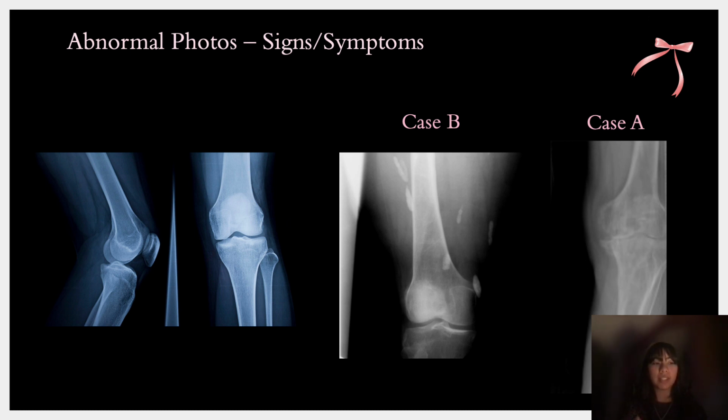And what happens is they basically shoot out in ulcers and blisters. They come out of your skin at some point. But if they don't come out of your skin and they reach that joint, then the female worm will die and release her larvae, and that will cause joint effusion, acute pyogenic arthritis, and joint pain. It also has a dead chainmail appearance, tangled and convoluted, which is exactly what it looks like here. Symptoms are a blister, swelling, vomiting, nausea, diarrhea, ulcers.